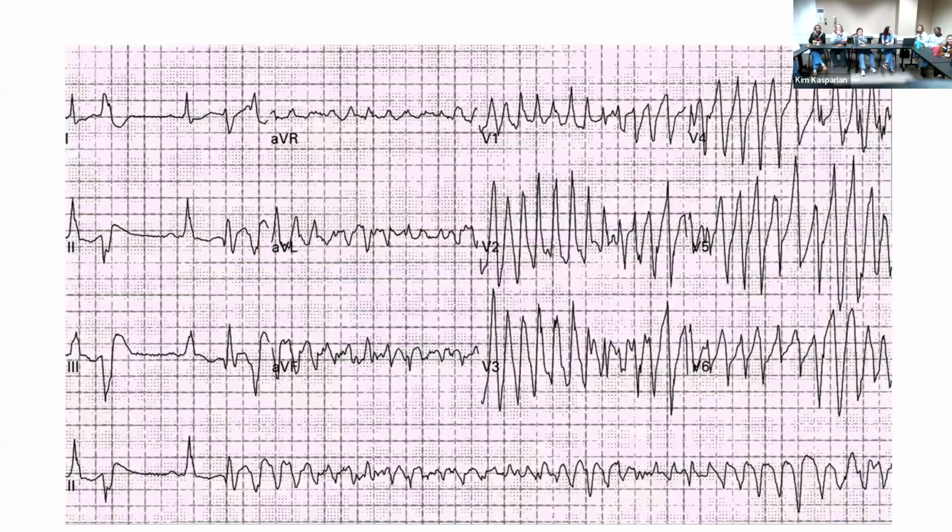All right, I'll give you a clinical scenario. This is a very good representation of a patient I took care of in the CCU. This patient we were giving dofetilide, which is a QT prolonging agent. And you have to measure the QT interval very frequently. And you should measure it by hand, which we learned the hard way, because the machine was telling us that the QTc was around 450 and it was actually around 600. So this patient did this, and we shocked him, and then he was better.